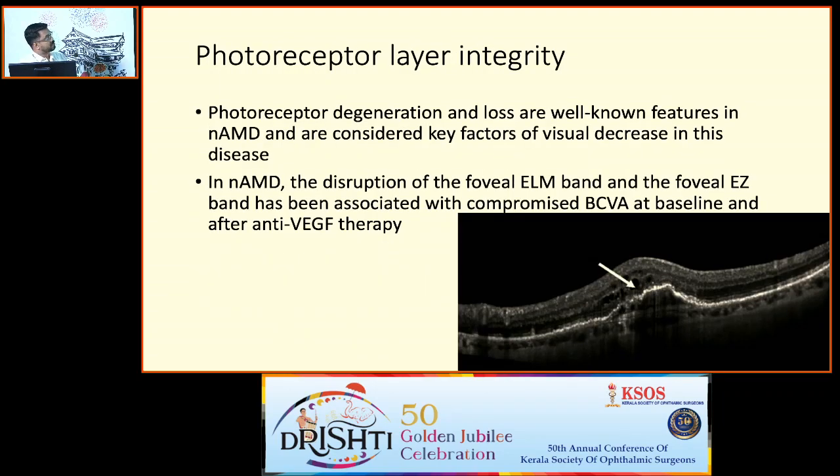And also photoreceptor layer integrity. As we have already mentioned in DME, photoreceptor degeneration and loss are well-known features in AMD and are considered key factors of visual decrease in this disease.